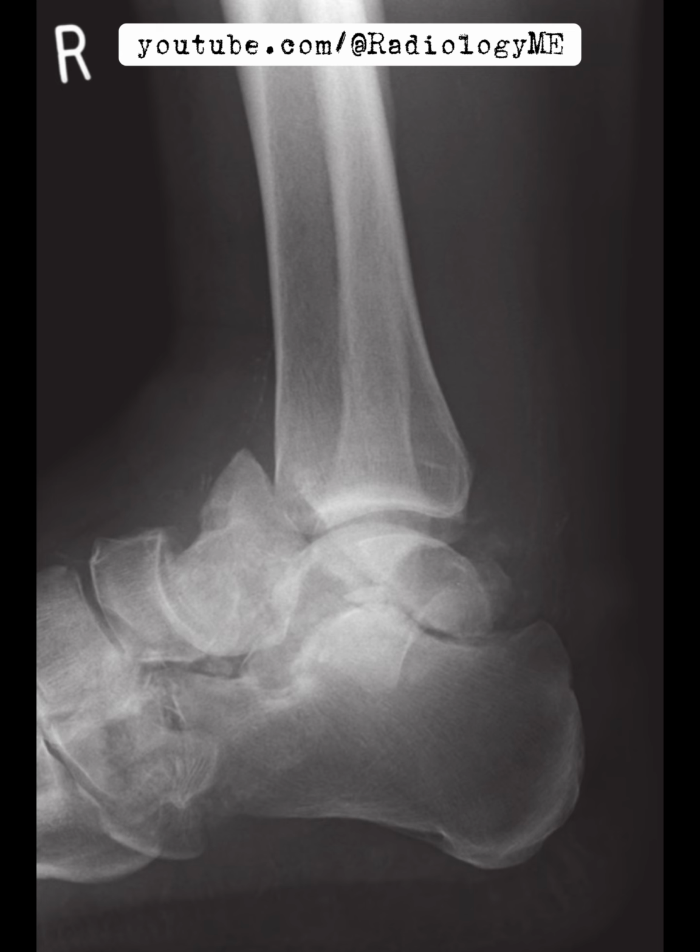There's a fracture dislocation involving the talus, with a notable loss of congruity at the talonavicular joint. It's not aligned properly, and I can also see that other joints around the region, especially the subtalar joint, seem to be out of place. This is always concerning. But that's not all. I can see a fracture running through the cuboid, with additional bony fragmentation in the calcaneocuboid joint. The entire area just screams instability, with remnants of the subtalar joint being completely disorganized.